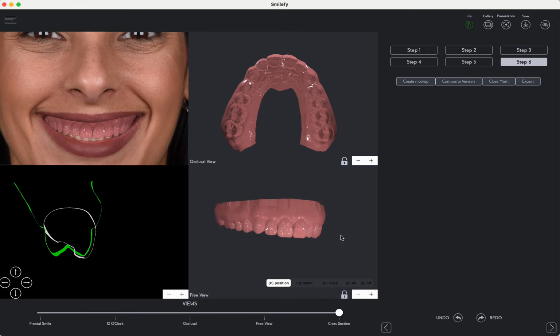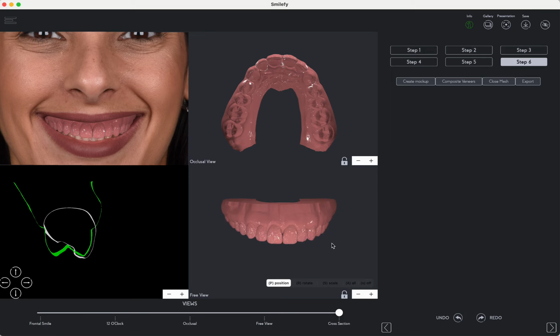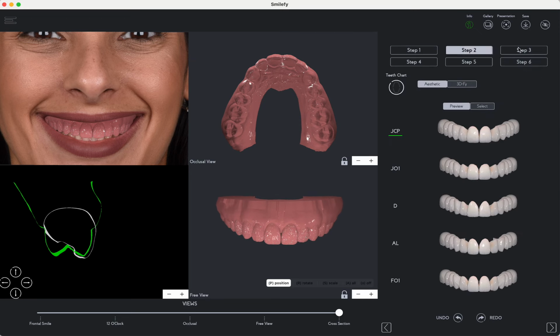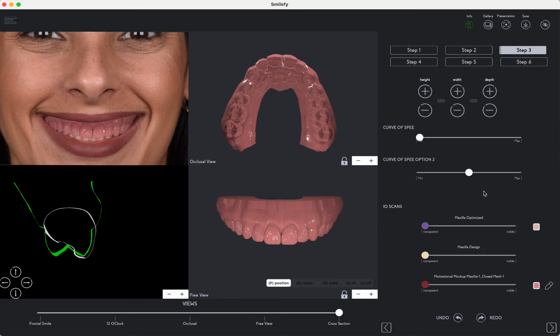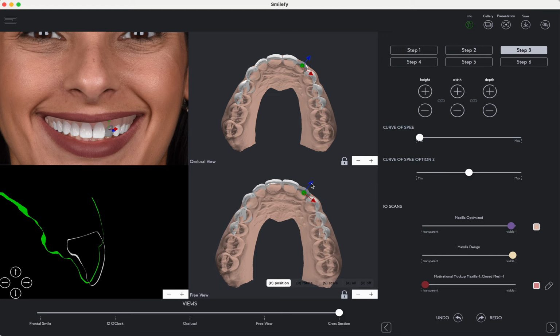As you can see, the model came back from the cloud closed. So now you can use this model for printing. And yeah, you can even create a second mockup, because I just see here something that I would love to correct, so we don't leave any detail of our design in a way that we don't like.